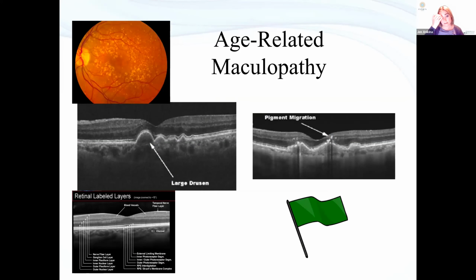So this is dry, and this is all dry. We see lots of these lumps and bumps, and it can often be quite scary to confidently say, look, there are no choroidal neovascular membranes, there's no wet AMD there. It's scary because you see these lumps and bumps and they look quite dramatic. But all of this is dry because, look at your photoreceptor layers sitting on top there.